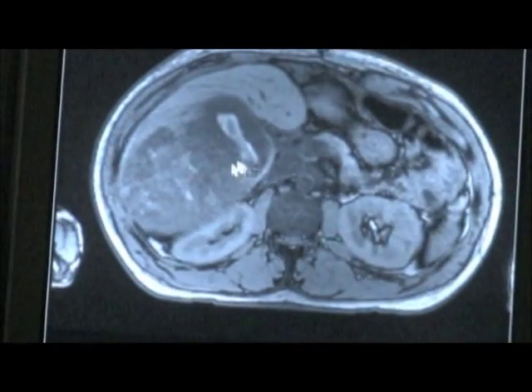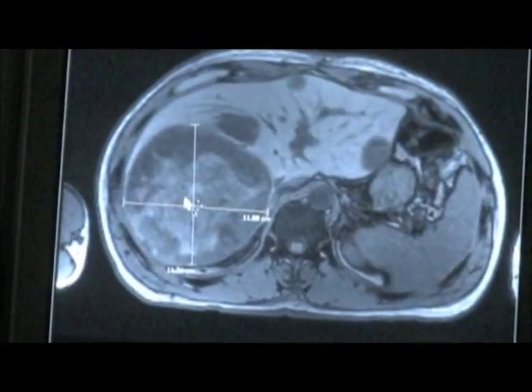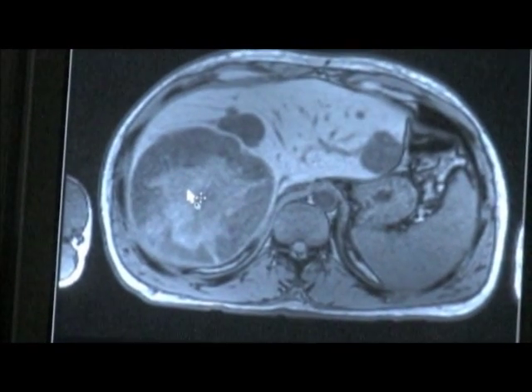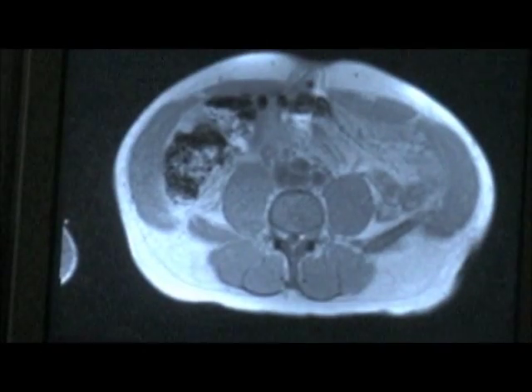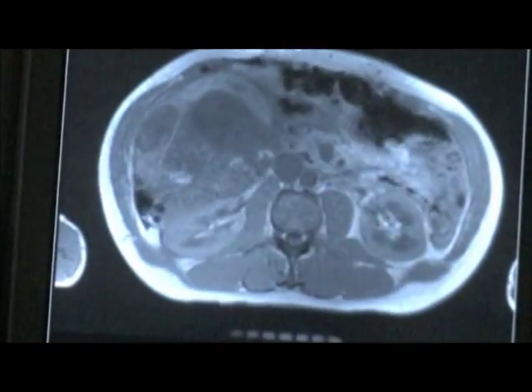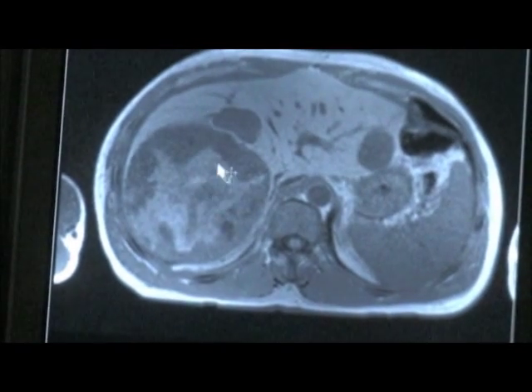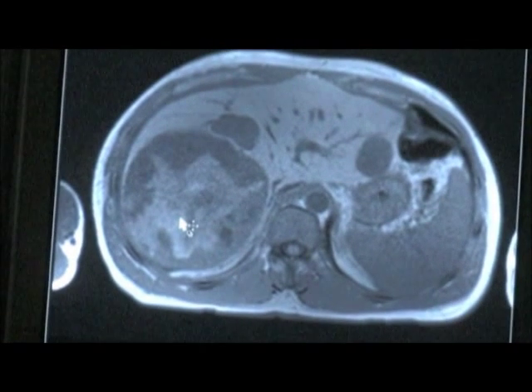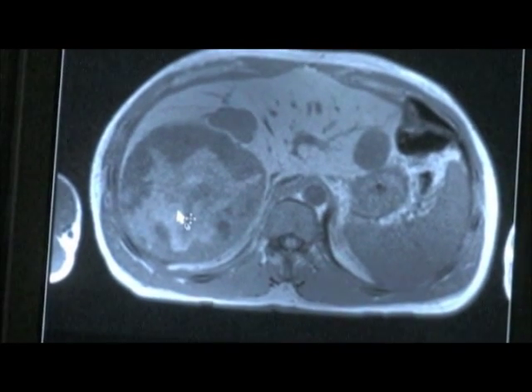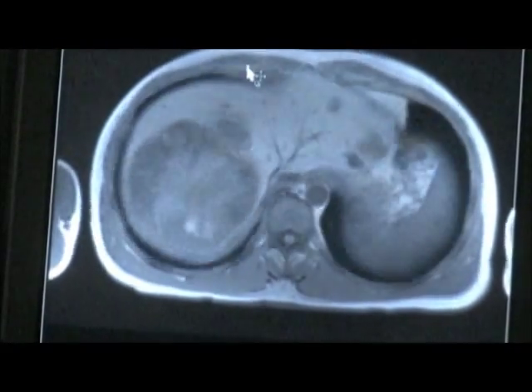In this case, we can see that there are regions of high signal intensity throughout certainly the larger of these masses, and high signal intensity on out-of-phase, and we want to compare it to the in-phase, which I'm showing you now. This is the in-phase. Both the out-of-phase and in-phase T1 showed it to us as high signal intensity, so we know it's not fat. That leaves us with either blood or protein as the most likely explanation for this high signal intensity.